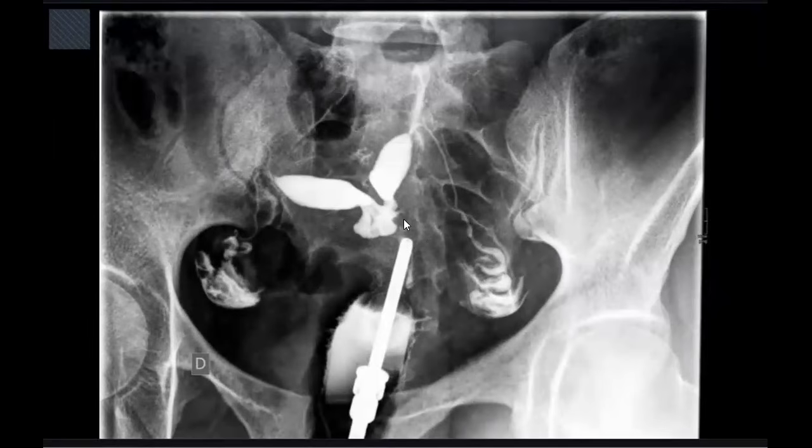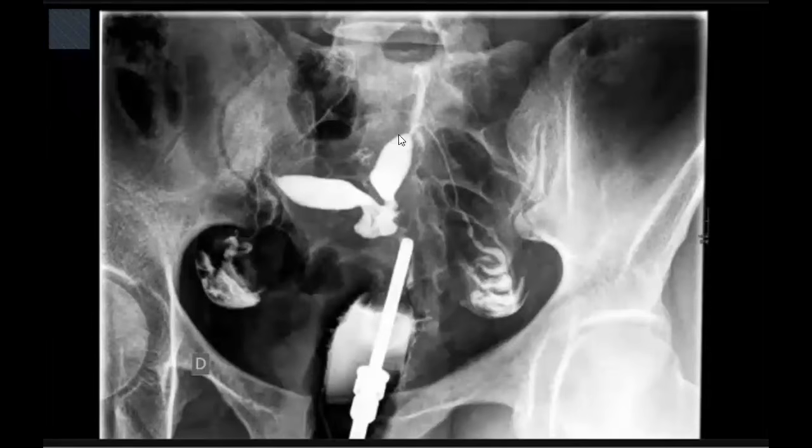About the uterine cavities, I can see one cervix. This is not two cervices. So we excluded here what? Didelphys or bicornuate bicollis. So one uterus, one cervix, we excluded didelphys or bicornuate bicollis. Then we go for the uterine cavities. There are two uterine cavities separated from each other. But in hysterosalpingiography, we couldn't see the myometrium. So we have two differentials here: maybe septate uterus, maybe bicornuate uterus.